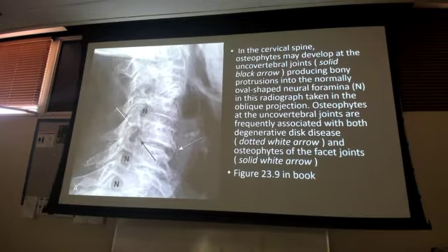But here is an example of what I was telling you, that cervical spine arthritis, right? These are supposed to be the neuroforamen. You can make out some of these nice open areas on these oblique views, particularly the two lower ones. But then look at the one the black and white arrow is pointing to. It's that big. I've got osteophytes coming in here, osteophytes coming in here, right? It's much more narrow and much smaller than my other ones that look normal.